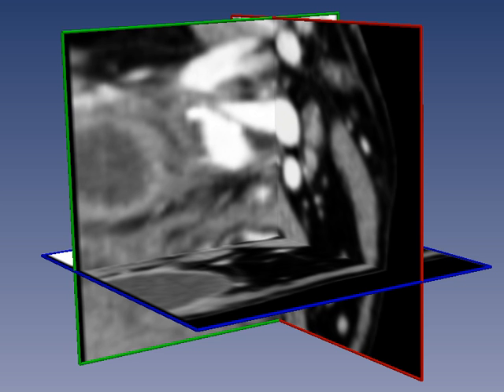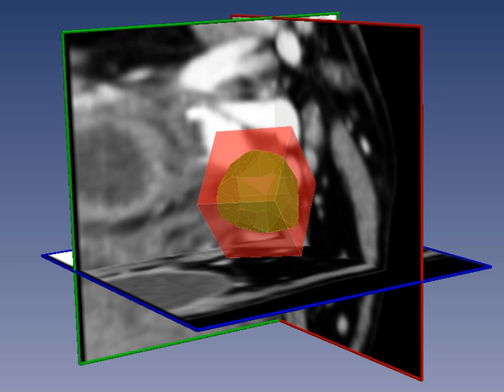From the segmentation, a 3D model is created. Based on that, the minimum volume bounding box is computed, from which the three-dimensional axes are extracted. In contrast to the current size assessment standard RECIST, those axes are independent from the spatial orientation of the node. These size features, along with all other extracted and entered features, are then automatically uploaded to the central NeoMark database.